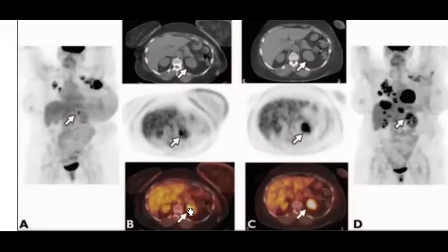Renal, nice. Renal uptake. That's why it was chosen to be in this. So we have renal uptake, and you can see whether there is progression or regression. If this is the baseline and this is the follow-up, it is progressive. Perfect, Nermeen. Yeah. So there is metastasis or infiltration. It depends. Is it lymphoma or is there primary progression?